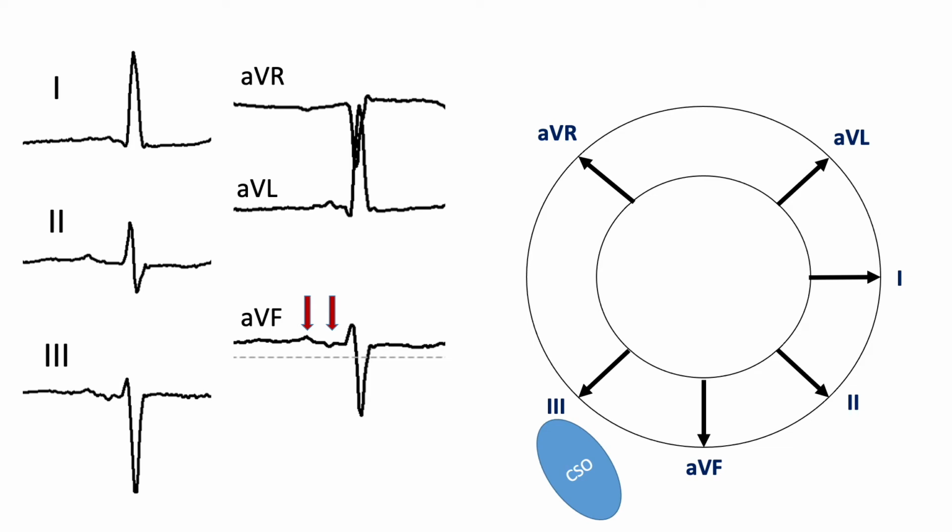Why? Because this patient received an extensive ablation on the septum from the left atrial side and also received ablation in the region of the Bachmann bundle. Normally we have an interatrial conduction which happens over the Bachmann bundle, septum, and also the muscular fibers of the coronary sinus. In this case, it looks like the only connection between right and left atrium is through the muscle fibers in the coronary sinus.